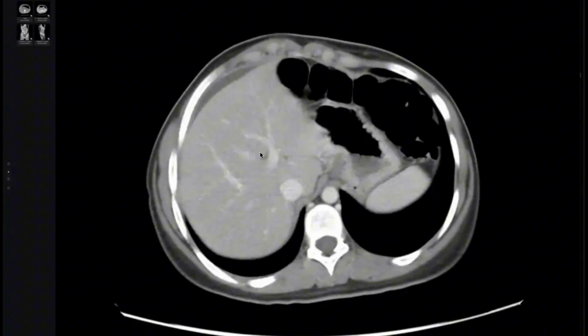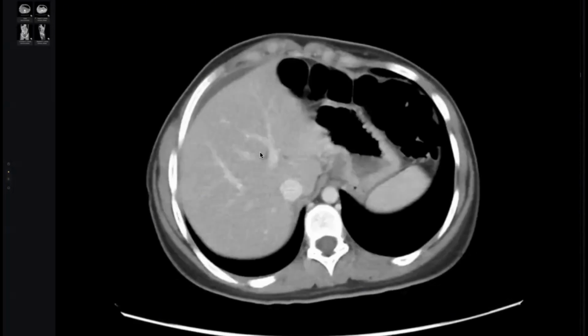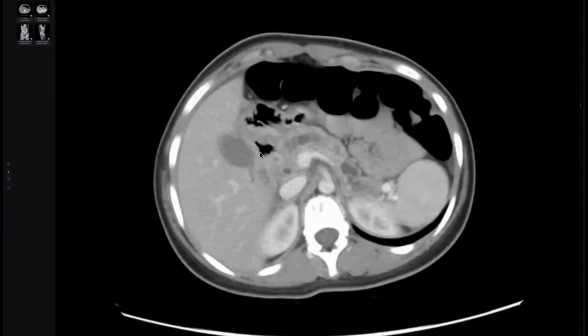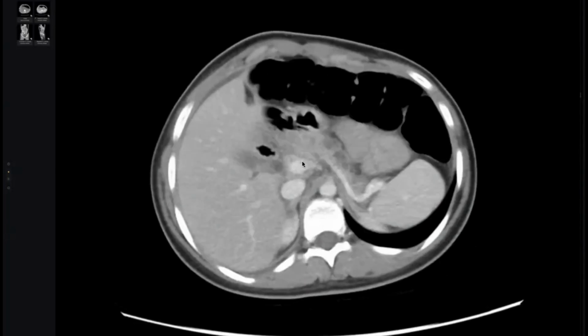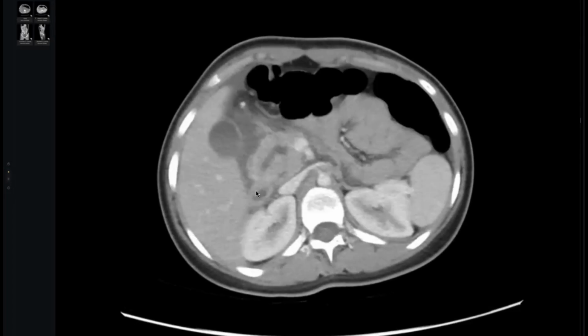This patient very commonly has many recurrent episodes of pancreatitis. Finally, you can find some atrophy here. Later on, you may find some calcification like this, if the case is neglected and there is no surgical correction, especially for this opening, to increase its capacity.